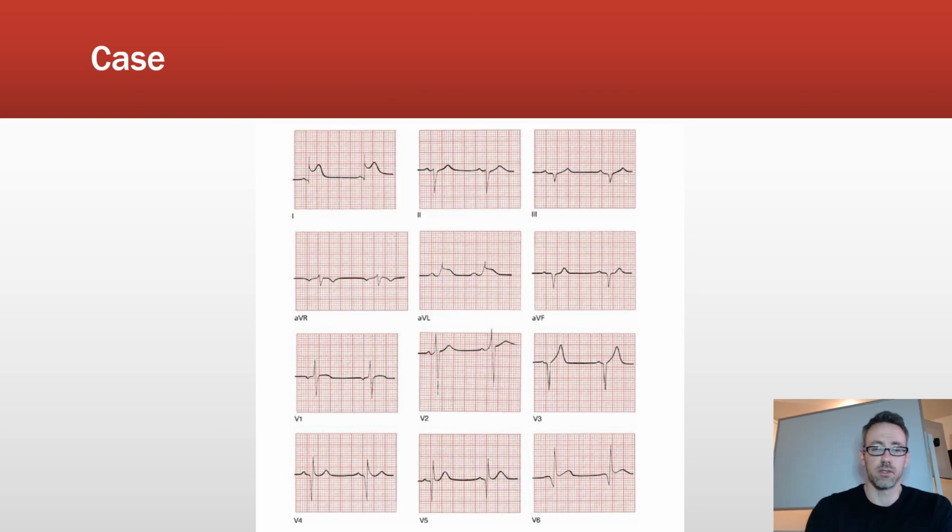And remember, we're looking for things like Q waves, ST segment elevations, or ST segment depressions. So if you look here, look at lead 1. All right, you can see AVL. Not so much V5, but maybe a little bit in V6 there. If our PR interval is our baseline, which is down here, you'll definitely notice that we have an elevation. Same thing in AVL, you see these elevations in 1 and AVL, and maybe a little bit in V6 as well. And so if we think about the placement of those leads, that suggests that there's an infarct in the left lateral wall of the left ventricle.